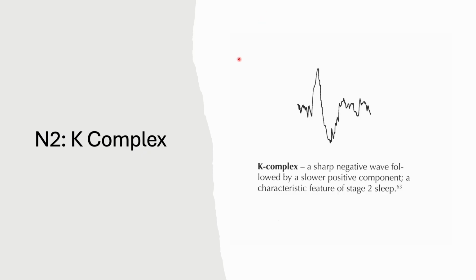Here's a decent K-complex. Negative, going up. Sharp. Then positive, going down. That is a K-complex, a backwards check mark almost. The difference is the downwards deflection going through and past the baseline, because I think they look a lot like vertex sharp waves, right? There's my baseline. It goes up through and down through. Almost looks like the exact same amplitude on each side.